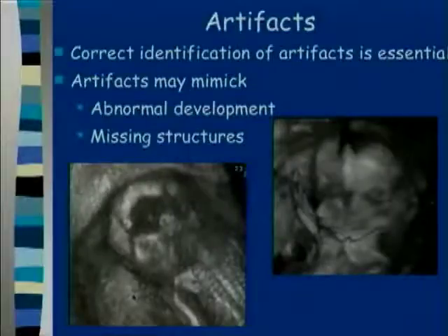Now, artifacts occur in the 3D ultrasound just like they do in 2D ultrasound, and you can see that it's important to identify that this is just an artifact of the rendering. It's not a hole in the head.